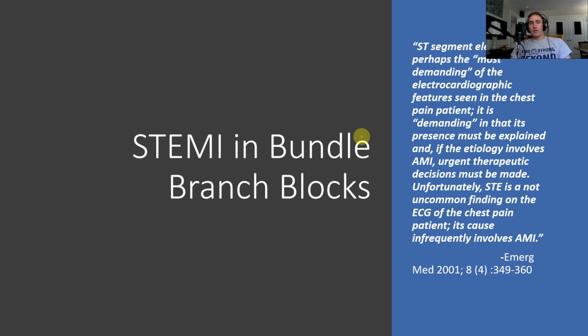We're going to move on now and talk about STEMI and bundle branch block. Some people might want to tell you that if it's a left bundle branch block, you can't diagnose a STEMI, and that is patently false. You can absolutely, unequivocally diagnose a STEMI in a left or a right bundle branch block using a set criteria that we're going to discuss.